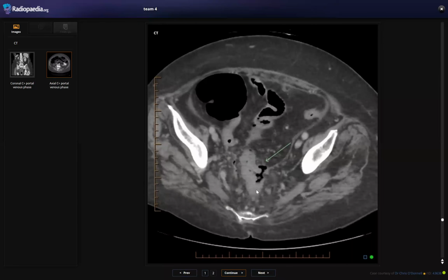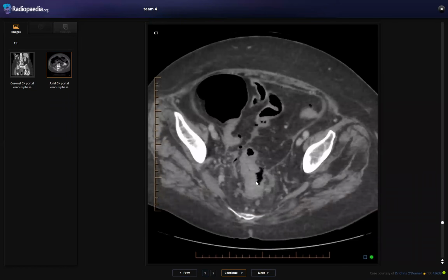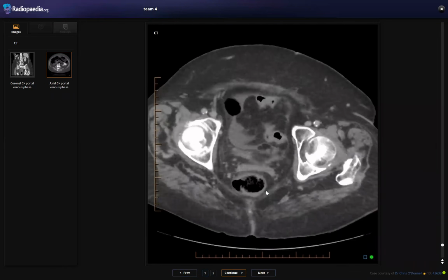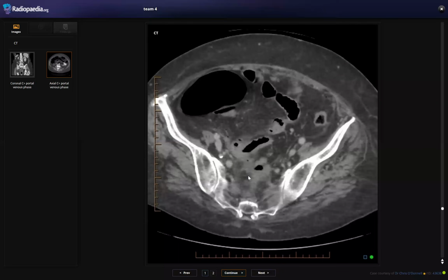There is evidence of irregular thickening of one of the bowel loops seen within the pelvis with surrounding fat stranding and lymph nodes, multiple small lymph nodes. So this is actually part of the sigmoid colon, and I think so. My diagnosis will be sigmoid colon cancer with multiple peritoneal and liver metastasis. I need to inform the clinician about these findings and refer to the GI.